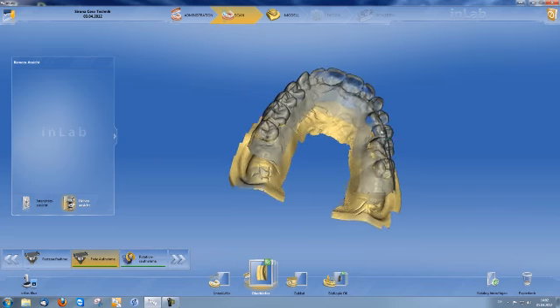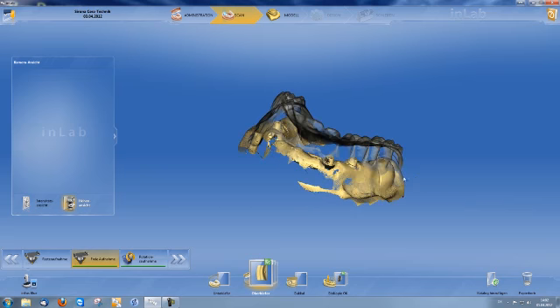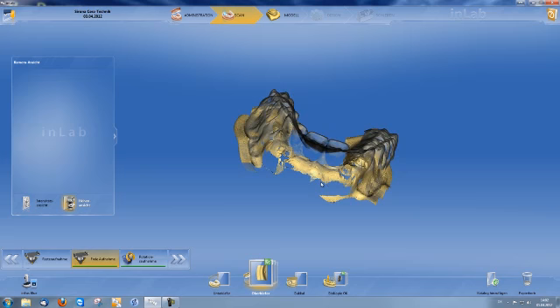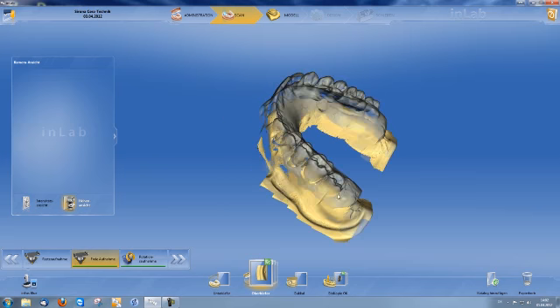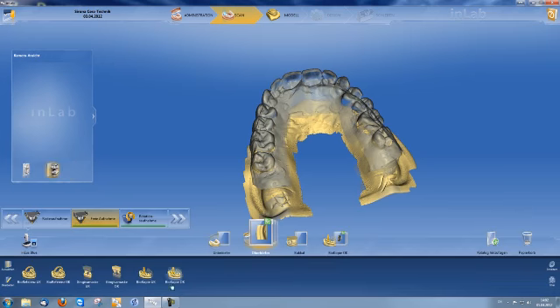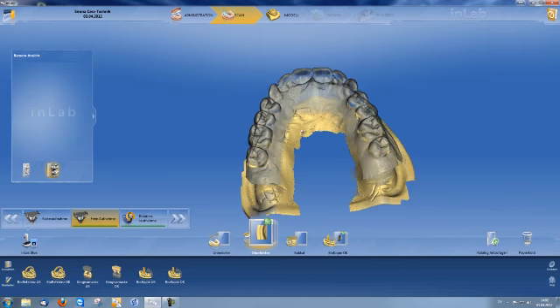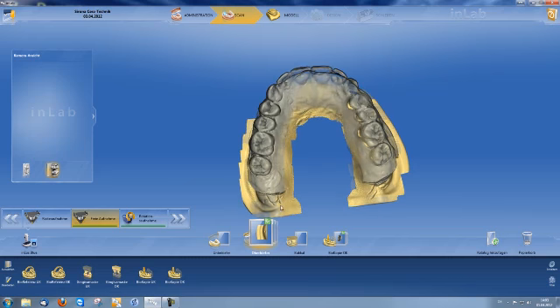Firstly, we have the preparation scan. We can see here the 4 telescopic preparations, and in BioCopy lower jaw, a wax-up was added under Add to Catalog. In this case, the final prosthesis. The software has calculated this automatically using small reference points.